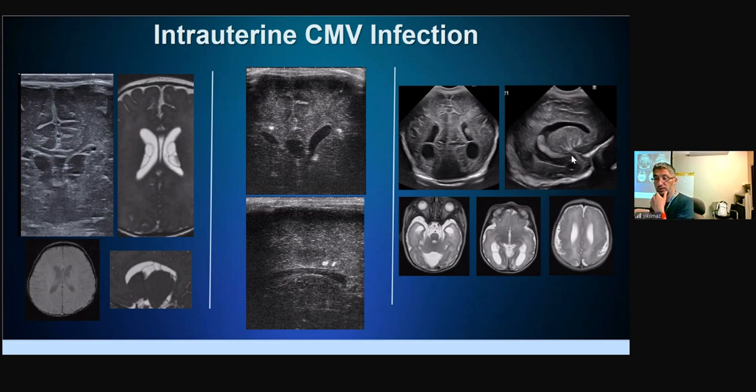not always with shadow. And periventricular cysts, they are bilateral, symmetric, adjacent to the atriums and temporal horns. And there's also polymicrogyria on the MRI, but you can never see it on the ultrasound. And this is associated with lenticulostriate vasculopathy here.